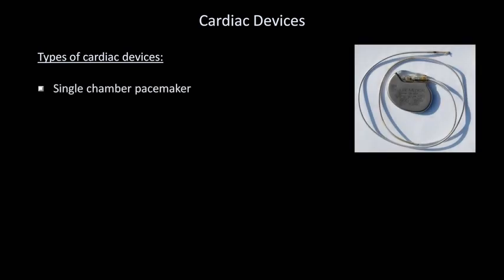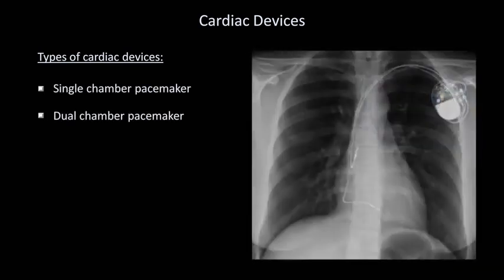I'll move on now to discuss some cardiac devices. There are about 6 or 7 which an internist should feel comfortable identifying. The most obvious are pacemakers, which can be single chamber or more commonly dual chamber. Here's a dual chamber model on X-ray.